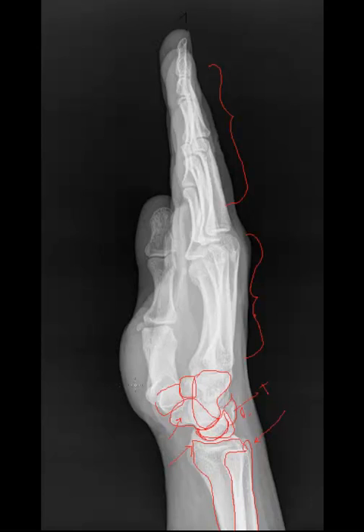Now the thumb, since it kind of lays off to the side, we can't identify those structures. This is the metacarpal. Here is the proximal phalanx. Sorry, I'm getting a little messy here, and distal phalanx, but you're familiar with this anatomy now, so you know exactly what I'm pointing to. Here is the interphalangeal joint of the thumb and the metacarpal phalangeal joint of the thumb. There's a little sesamoid bone. We saw it on the other projection. We also want to make sure that there's no ligamentous or tendinous calcifications or soft tissue calcifications within this region.